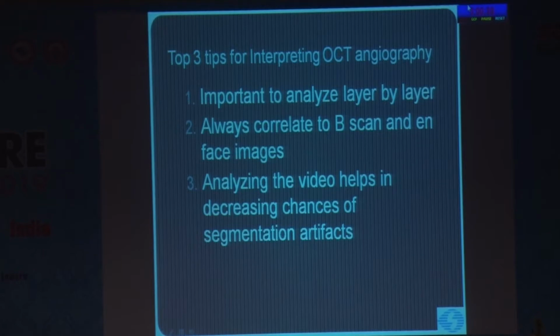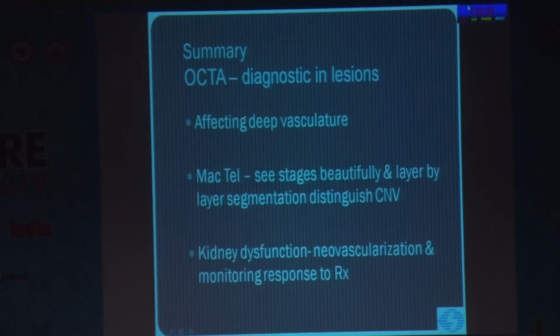I'd like to conclude with 3 tips for interpreting OCT angiography. Please analyze layer by layer. Always correlate with the B-scan, and as we heard, with the en-face images. And analyzing the video helps in reducing the chance of artifacts, which are very common with this technique.